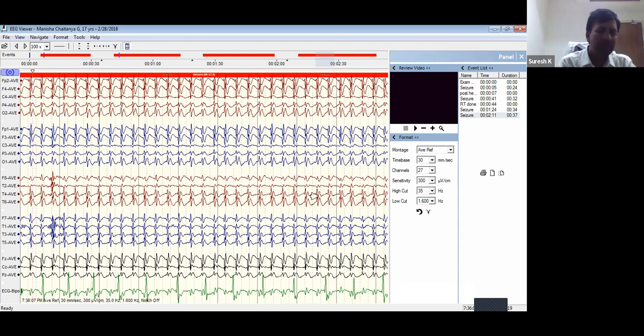So normally, most of the time, the problem we encounter is that we keep the patients on some drugs, so EEG changes will happen with them. So you see both focal discharges and generalized discharges, and it is the history actually which gives a clue, and the age and the type of discharges give the clue that we are dealing with JAE, because it is commonly mistaken for complex partial seizures of temporal onset.